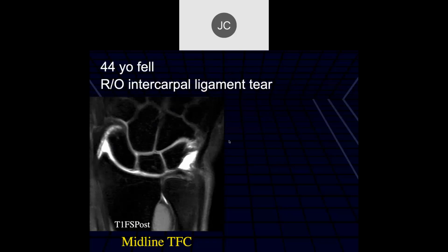Let's see, who's next? Okay. 44-year-old fell, rule out intercarpal ligament tear.